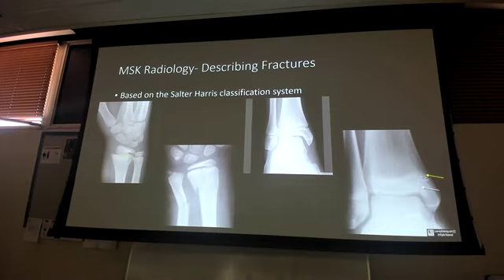That's your type 1. The fracture is only through the physes. It's hard to see a fracture through the physes because there's already this line sitting here. How do I know it's fractured? Because it's slipping off of where it should. Think of an ice cream scoop slipping off of the cone a little bit. Everybody see that on the first one?